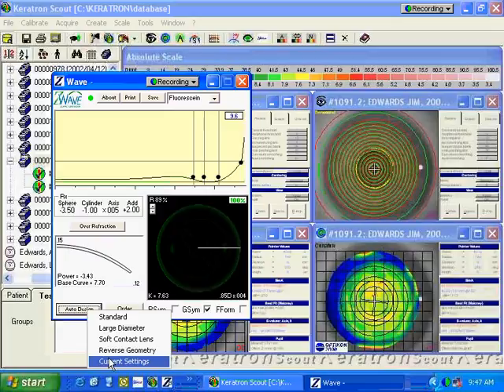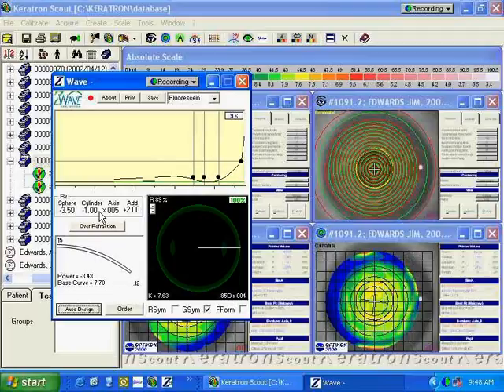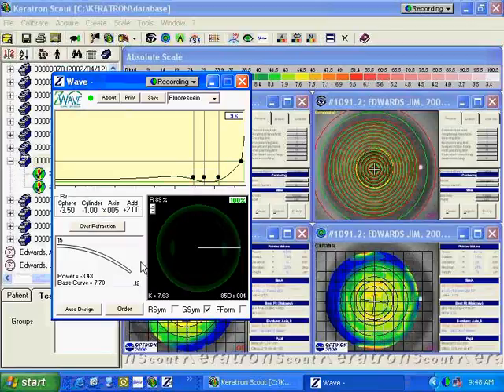Now, the way the software works, it will mask off the refractive or the corneal astigmatism that may or may not match up with our refractive astigmatism, so we may look at the over-refraction. The program does a cross-cylinder calculation and shows us in this case there's an insignificant difference between the two of them, so we don't really need to enter any over-refraction information.